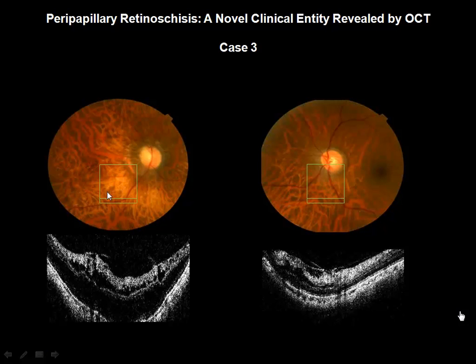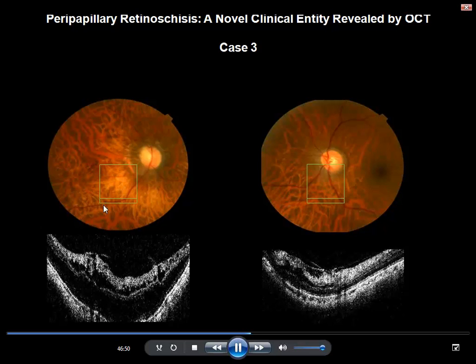Right eye is -18. He lost his vision over the last month. It's down to light perception. And he has splits 360 degrees around his optic nerve head. Here we're just showing you one inferiorly. The reason I'm showing you that one is because here there's really good evidence that we have traction. So this is vitreal traction onto the retina, causing this elevation, probably causing the split itself.